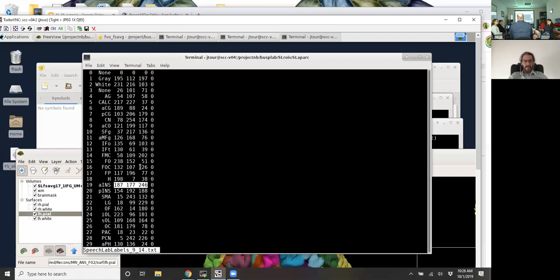When I say index, you can use that generally to mean there's a region label and a number next to it, and I'm going to call that the index. In this case, for the annotation files, it does not.